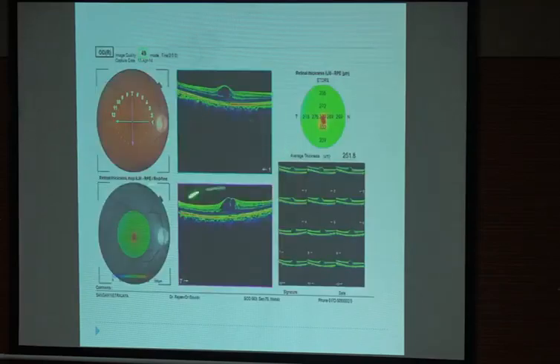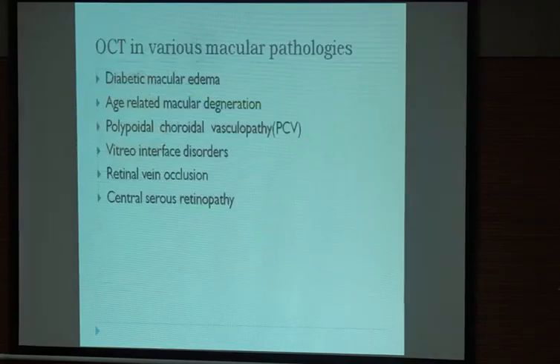We can also generate a report. We can see the 12 scans in all the 360 degrees. We can have 12 scans, and we can have the report of the scans.